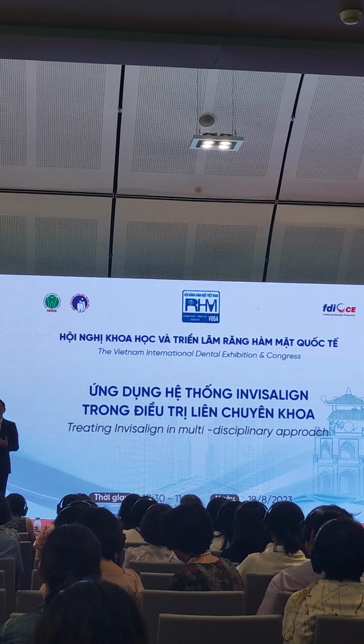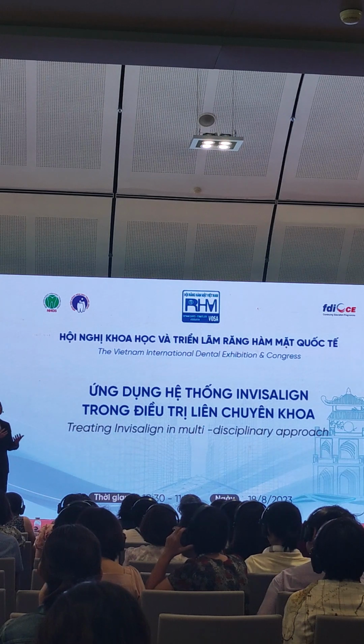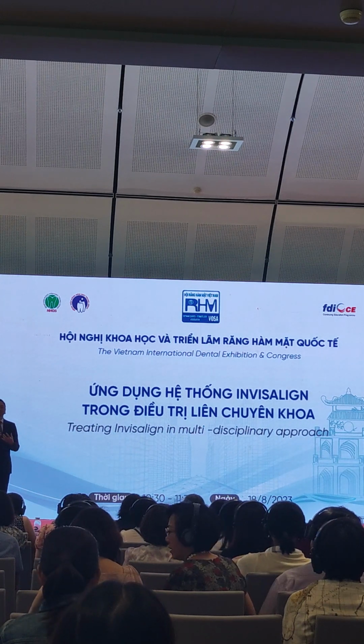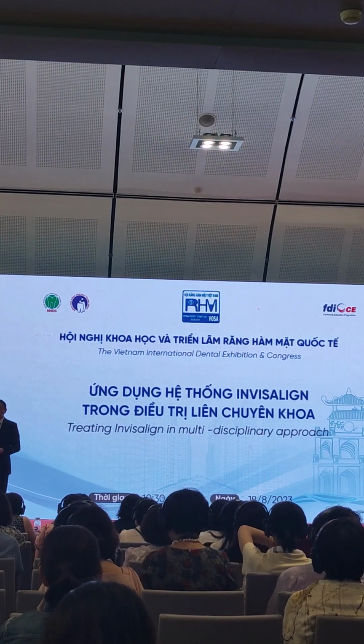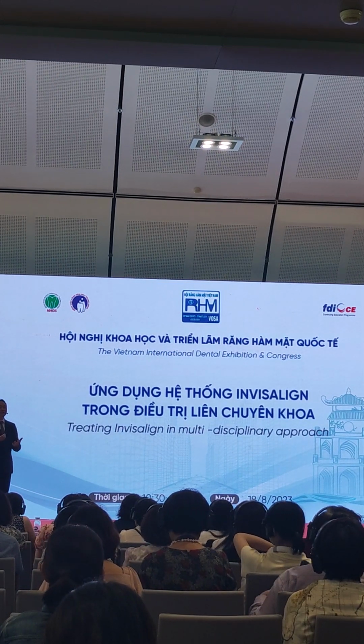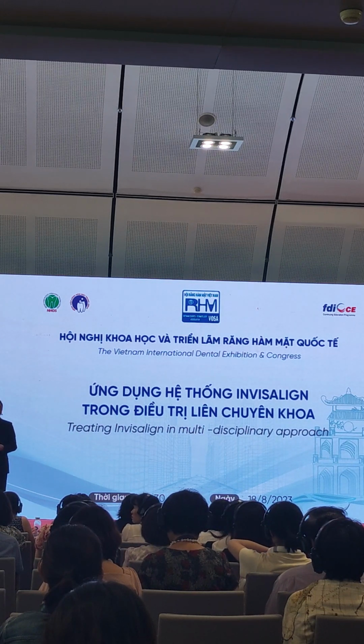For aligner treatment, we always do the easier things first to prevent early off-tracking, and then do the more difficult ones. So it is very predictable. I don't use any attachments for lower incisor or lower anterior intrusion. For the posterior, it depends on how many posterior teeth we need to intrude.